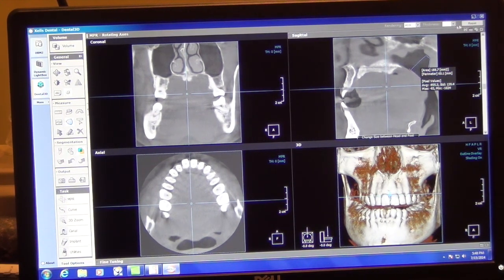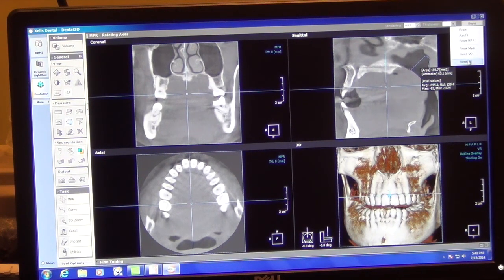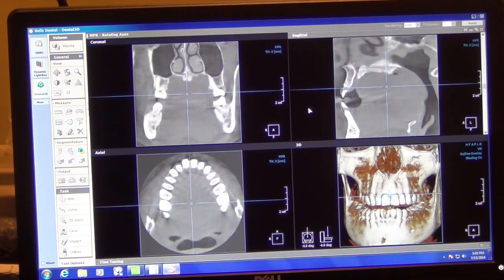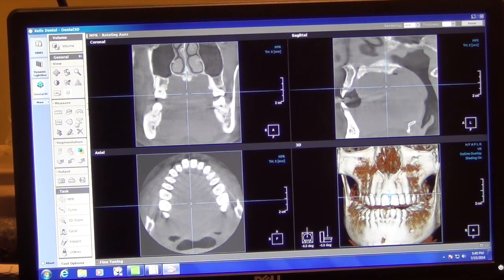Okay, so that might have limited value. If, you know, I'm trying to think about the value there, where you would really use that. I think if you were doing something as far as doing movements in orthodontics to open up the airway a little bit, maybe it can give you better than just a single point-to-point measurement to see if you're actually getting more area. Yeah, okay, that makes sense.